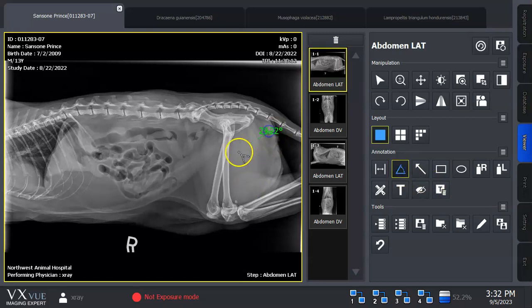Angles can also be drawn by clicking and dragging and clicking again. Arrows, squares or rectangles, circles or ellipses. Right label will throw an R on the top left corner of the image. Left label will throw an L on the top right corner of the image.